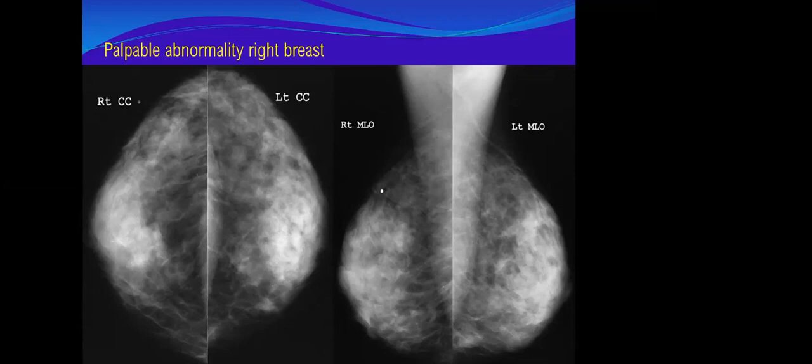Look at this location for any abnormality. Could you see any abnormality? In the CC, yes, I can see it in the outer, comparing it with the left.